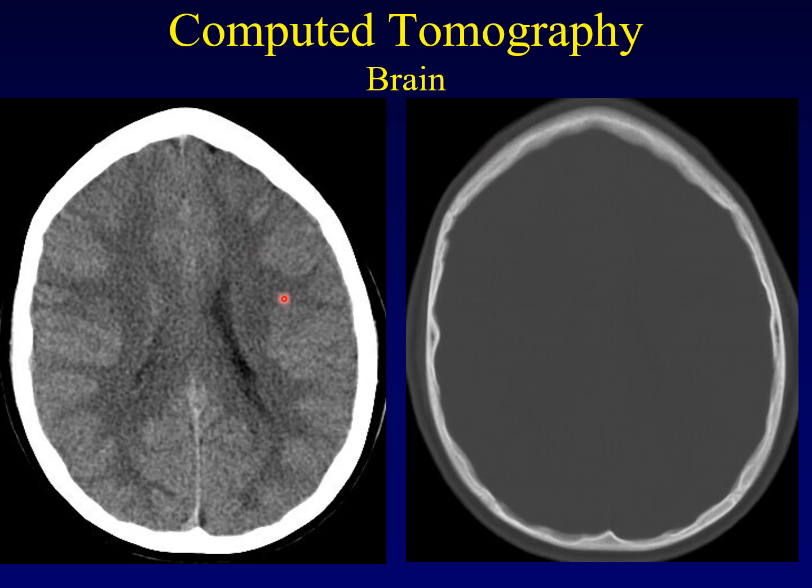So which of these is better? They're both absolutely necessary. In order to evaluate a CT of the head, you've got to be looking at the brain using this window and the skull and scalp using windows like these. They're both really important.